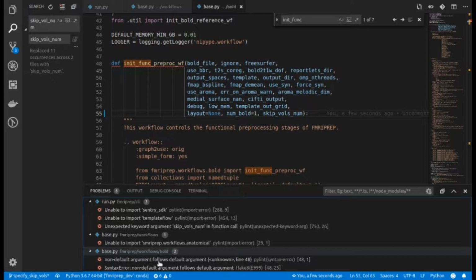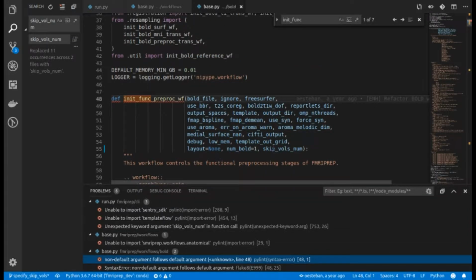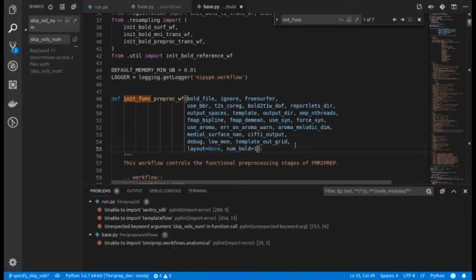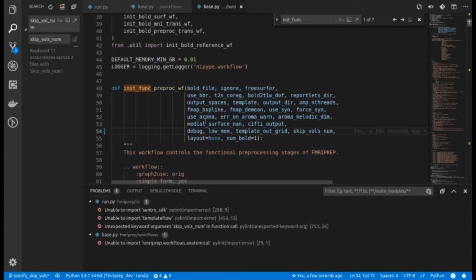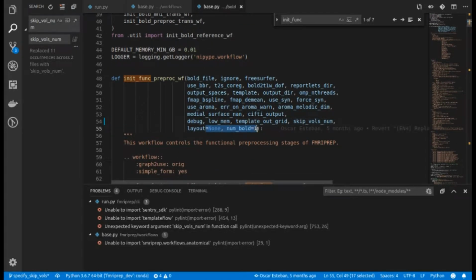On default. Oh, these. Okay. Right. Yeah. The non-default arguments cannot, or essentially, if you initialize your argument with an equal sign in the definition here, you can't have a non-default argument that goes after these types of parameters that give an initial option. Right.